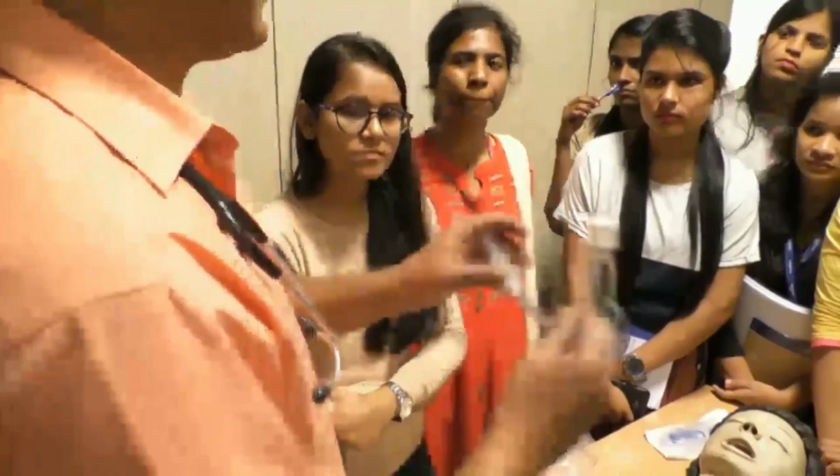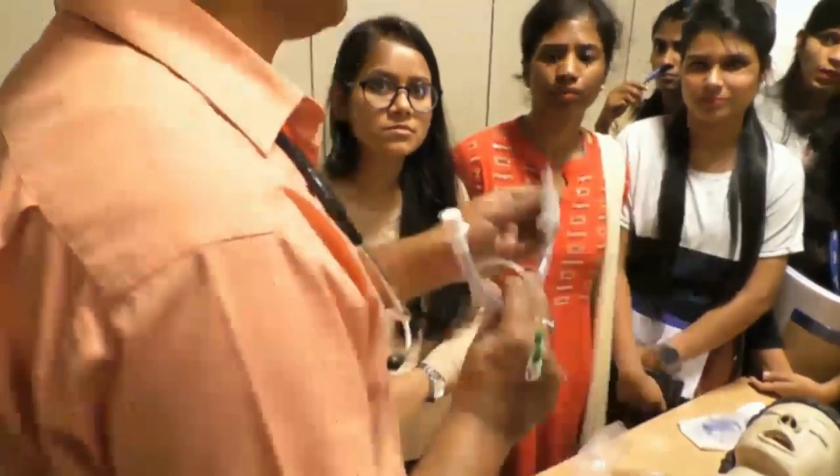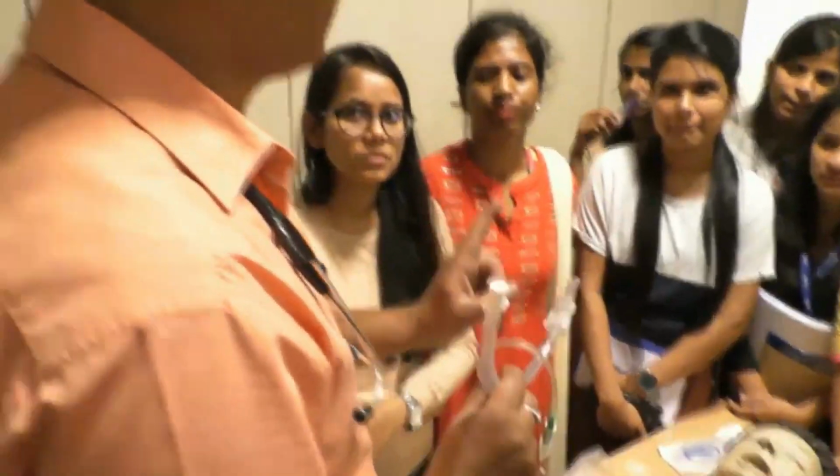Not for fixing or anything else, only to prevent the air leak. Only one answer: to prevent the air leak. Not fixation, this, that, no. Only to prevent air leak.